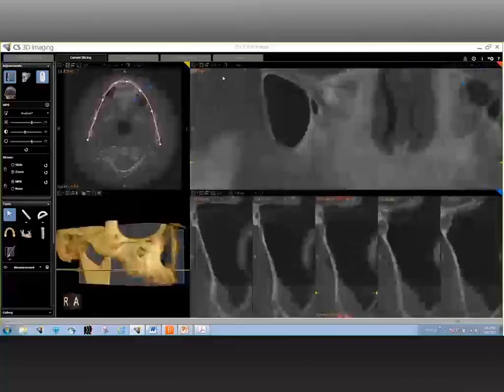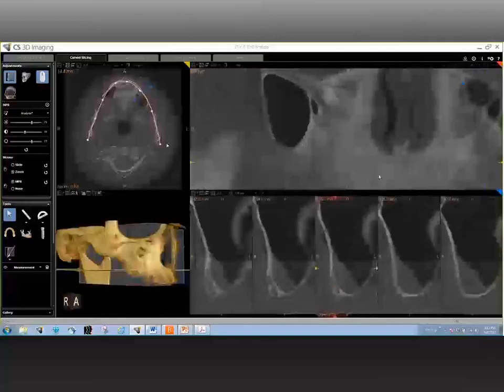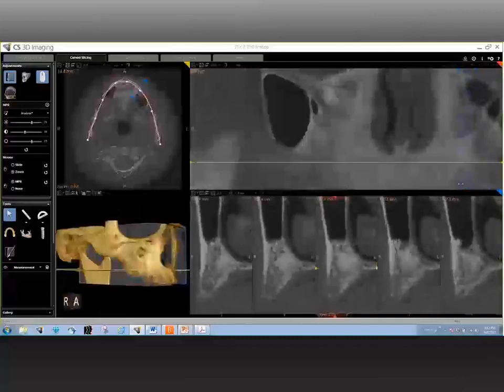Now, if you go to the contralateral, I'm sorry, Jordan. Go ahead. I just noticed something as you were scrolling through there that I wanted to point out. Does the bone look different on the contralateral side? Yeah. Keep going. Right here. You are correct. You have good eyes on that.